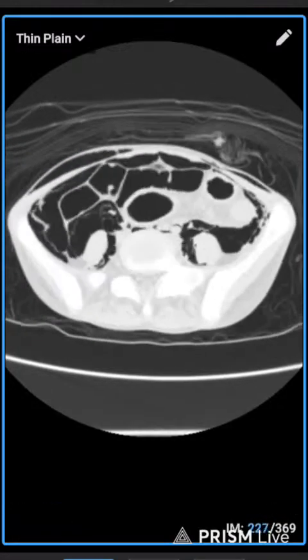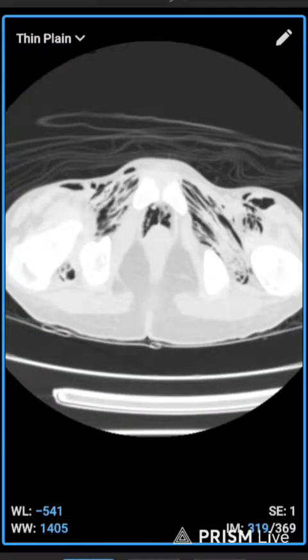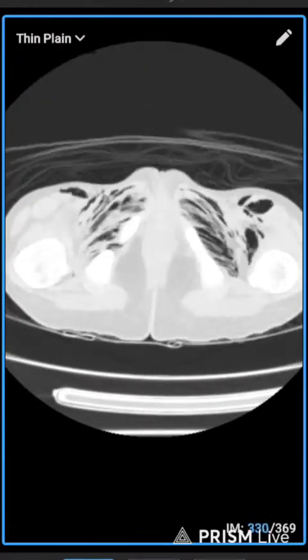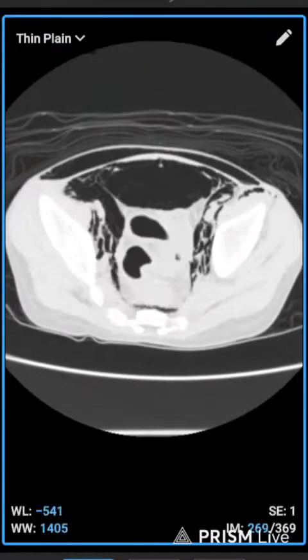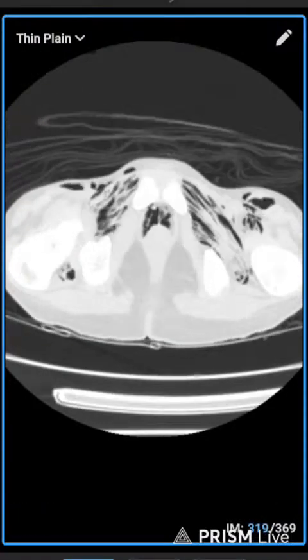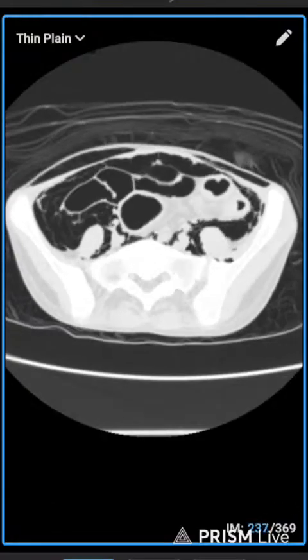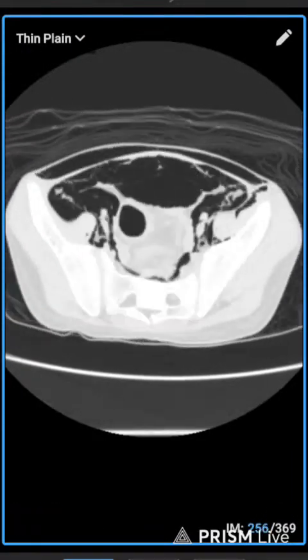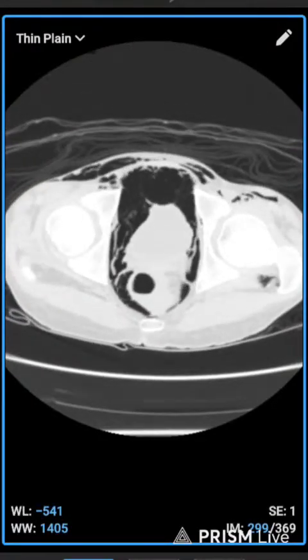So it's called emphysema. Emphysema is seen in muscle, in injury, or in the thorax also. In a ventilated patient, with some type of injury, or a leak of air through the trachea or some part of the lung, it goes to the air in the muscle.